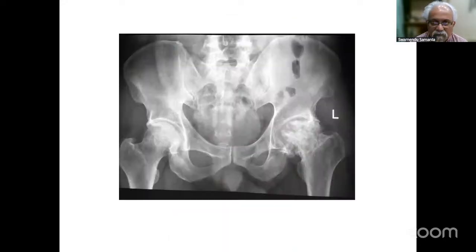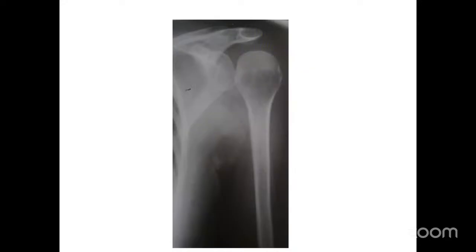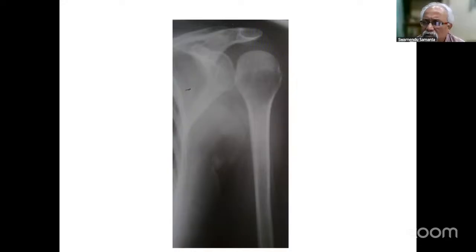Okay. So you can say that the shape of the shoulder does not look like a true AP X-ray. Yes. Although the scapula is showing an AP view, the head looks like it's not an AP X-ray. Yes, very good. So I just give you this next question. The examiner will ask you how, clinically in an emergency with a shoulder injury, you will suspect that he might have a posterior dislocation of the shoulder, in one test, one line.